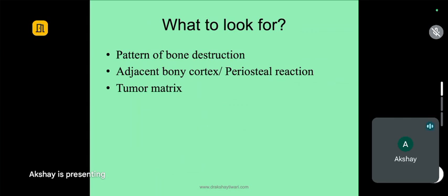आपको सिर्फ 3 टाइप के ट्यूमर मैट्रिक्स याद रखने हैं. Osteoid, chondroid and no matrix at all. एक चौथा मैट्रिक्स होता है फाइब्रस, जिसको ग्राउंड ग्लास बोलते हैं. वो आपको याद रखने की जरूरत नहीं है, आपको फाइब्रस डिस्प्लेजिया का एक्सरे नहीं मिलेगा. ठीक है ना?